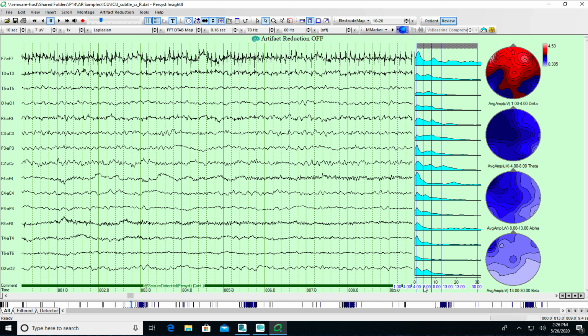Now, along the bottom of this frequency display, the FFTs for each channel, we can see the frequencies indicated for each one of these ranges that are at the top. So let's talk about ranges. If we right-click on this, we'll get a Properties menu.